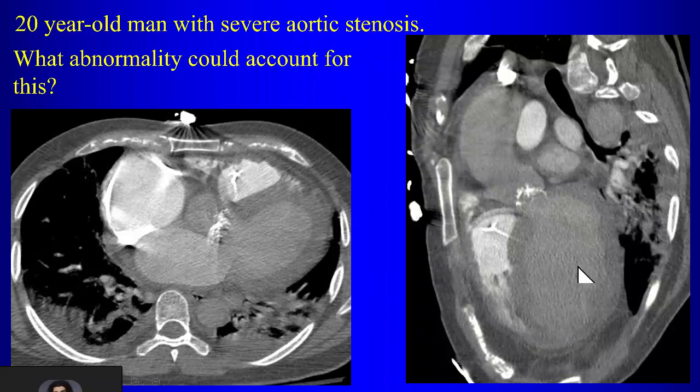No. And with the dilated left ventricle, the fact that he has bilateral effusions are going to make you think what? Yeah, so it's decompensated, right? So the patient's developed some failure here with bilateral effusions, big left ventricle. This is a 20-year-old, okay, who has severe aortic stenosis and calcification there of the aortic valve. What do we think is wrong with this person?